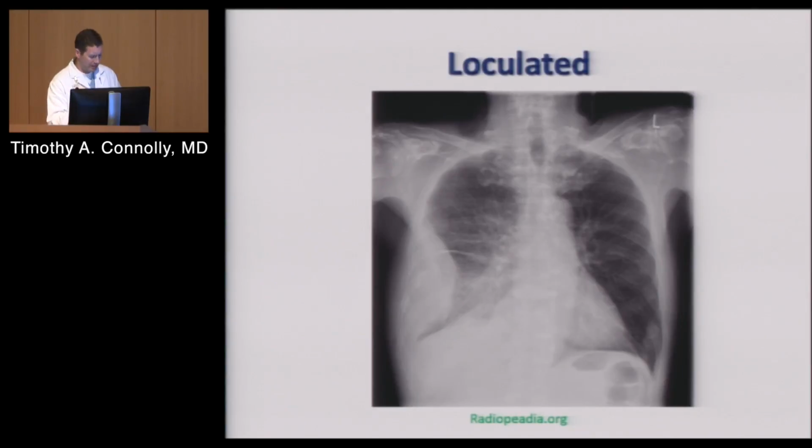This is where it gets tricky. So when you look at this, if this line came down and then went to here, fine, that would be fantastic. But where in nature do you see fluid do that? That obviously indicates there's some inflammatory component and it's been walled off or partitioned into segments. You're never going to fix this situation by simply a catheter to drain.